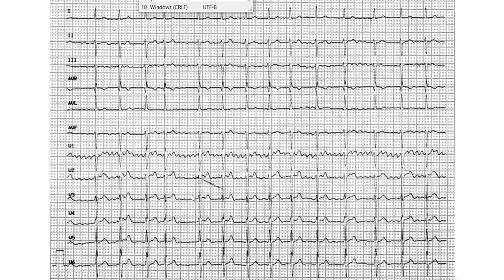So this is very typically going to be either fibrillation or flutter, and we can tell based on the frequency. Okay, this is question 19, by the way. You can check roughly for the rhythm. It roughly almost looks regular, question mark. Some points are very questionable though. Might be irregular there. Might be more than 0.16.